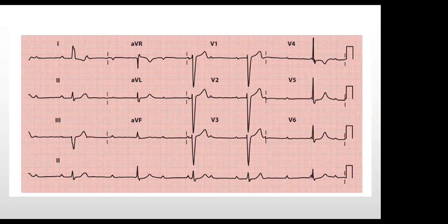Do we agree with that? Dr. Henry? Dr. Bassi, Dr. Abibola, Dr. Faye Chikani, Dr. Afiam Bassi, Cassidy. What do you think? Do we agree with that? Is there something more on this ECG?